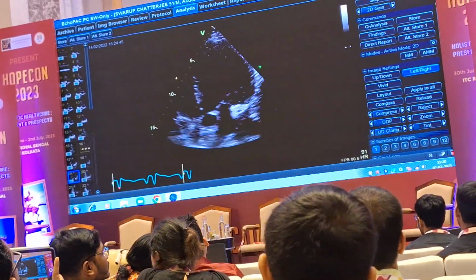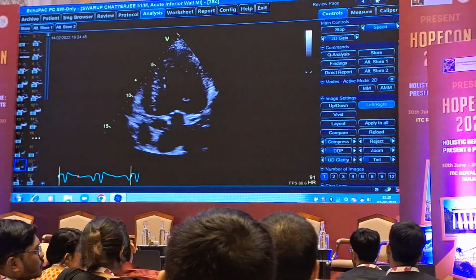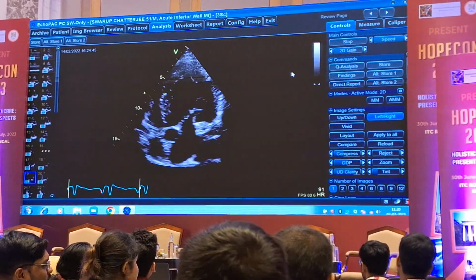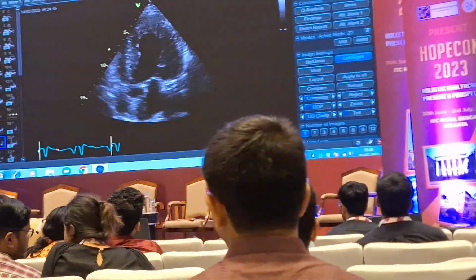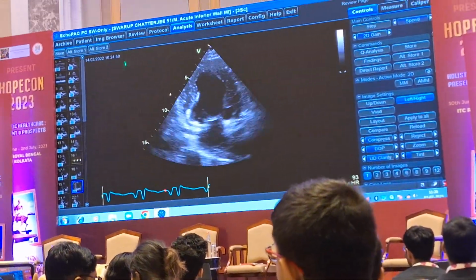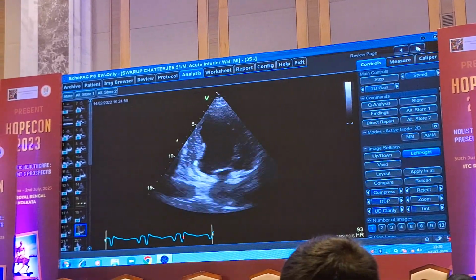So from the 2D views in different rotations, many directions are possible. It is sliding, tilting, pivoting, etc. From there, you get a lot of views and do the 3D analysis. But nowadays, 3D is also available. Now come to the two-chamber view. This is a classical two-chamber view. I told you. Here is the classical scar you can see now.